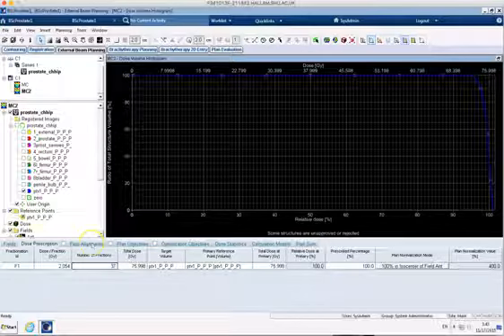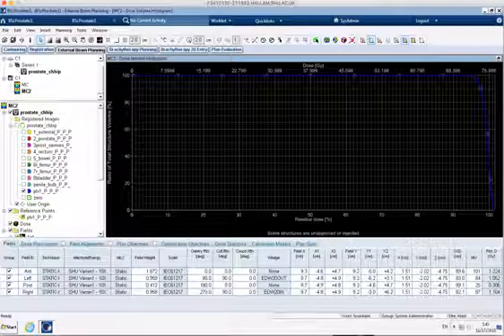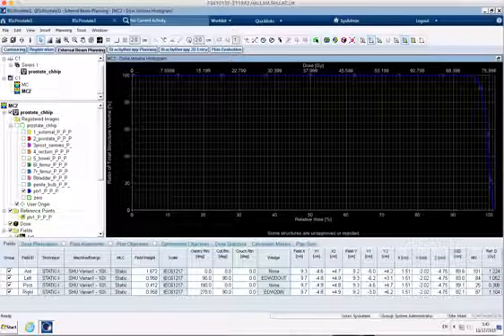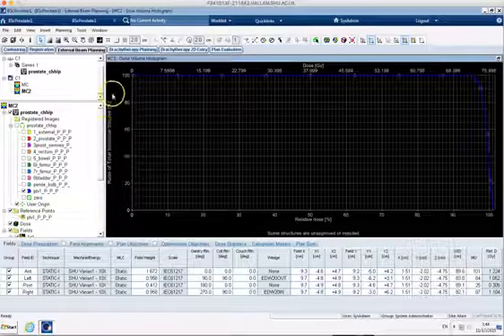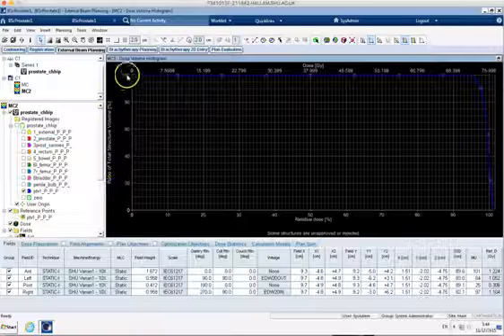Right then, let's have a look to see if we're meeting our parameters. I said my D98 should be 95% of the dose to the structure at 98.